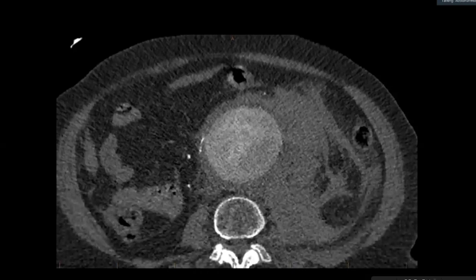Okay, excellent. That's beautiful. So this is a CT aortogram, CT angiogram, contrast enhanced arterial phase CT of the abdomen. All of these are synonymous. You can use all of these terms. You correctly identified the abdominal aortic aneurysm, which you can see here. You took a little bit of a while, but you did very beautifully describe this retroperitoneal hemorrhage, hematoma. So this is a ruptured abdominal aortic aneurysm.